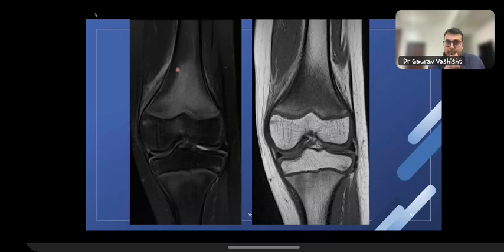Happy. You will enjoy this case. So these are the MRI coronal fat suppressed images of the knee joint. Again, skeletally immature. The growth plate is well seen. Here we are able to see the difference between this hyperintensity as well as this hyperintensity. So there is a difference between this bright signal and the bright signal in the distal femur, correct? As you compare it with T1 weighted images, this dark appearance on T1 weighted images is more than what we see here in the tibia, correct? Any doubts? Let's go further.